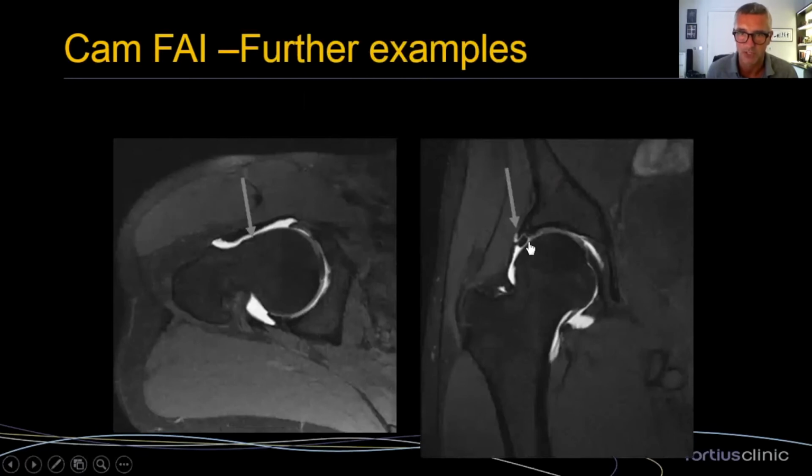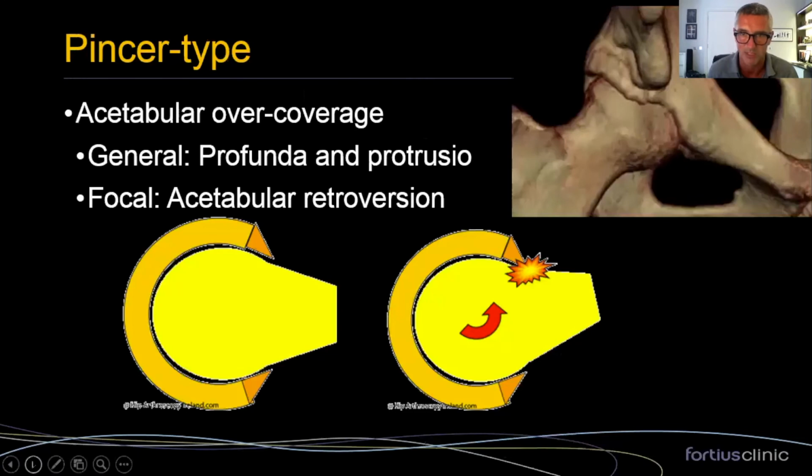You can see the contrast here just cutting right the way through the labral bone interface and then going into that paralabral sulcus, and then this is the associated cam lesion. What's interesting for me is that you often see a tear in the superolateral position and the cam lesion in the anterior position. It just shows, because of the rotational element, it's not quite straightforward.